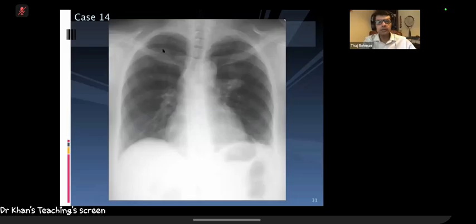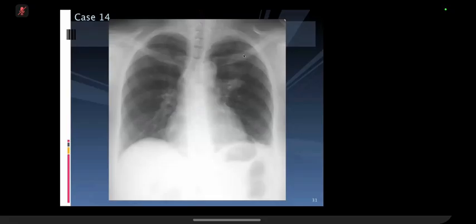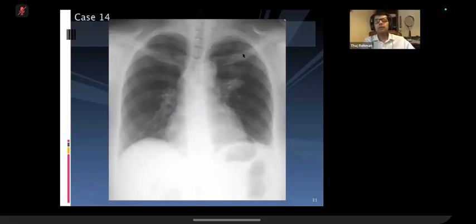So you can see the blood vessels all here. Are you seeing similar blood vessels here? No, I'm just seeing very grey pixelated images, unfortunately. I think it's probably something on my side. Ah, right, so probably that's a bit difficult. You really have to view it on a large screen with maximum density.